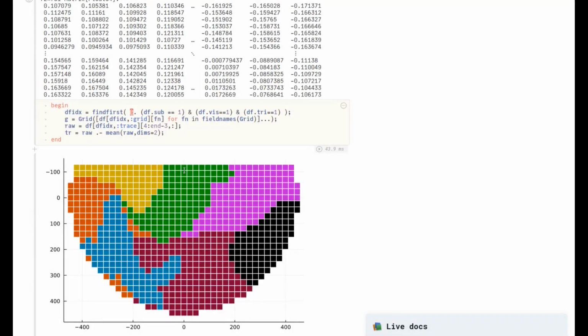Using the center of the detected cornea as a reference point, we quantitatively analyze the video. The cornea is divided into overlapping boxes, and quintile pixel intensity data is extracted for each box over the entire video.